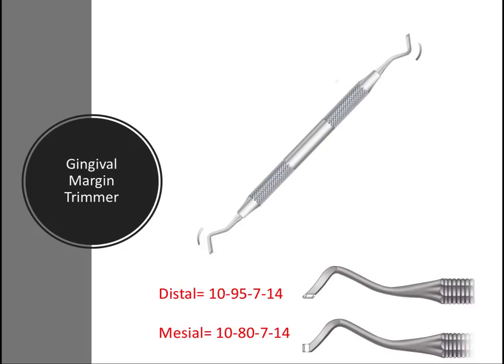And next we have the gingival margin trimmer. Again, similar to the last two, except this instrument is designed for planing enamel at the gingival floor of a prep rather than the facial and lingual walls. The cutting edge is most importantly not perpendicular to the blade of this instrument. So there's a second number in the formula to represent that.